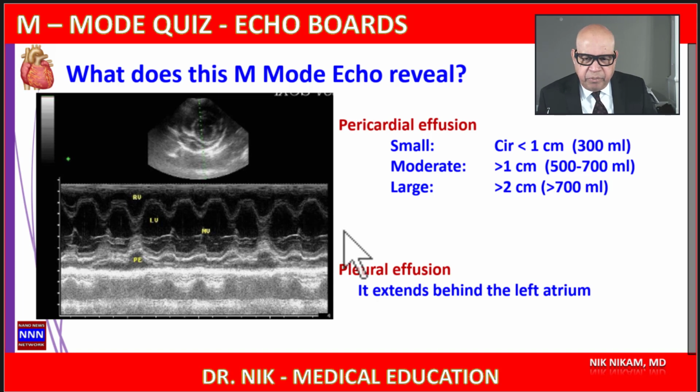In order to really pinpoint the diagnosis of pericardial tamponade, we need a better mitral valve echo along with respiratory cycles marked, so we can see the mitral valve movements during the various phases of the cardiac cycle.